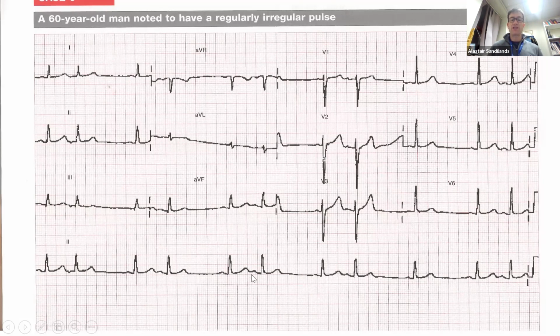So you can see, imagine that this is just one beat of an atrial ectopic, just one beat on this. Okay, it doesn't go any further. Any questions about that? Okay, so it's just trying to explain a concept to you. So this is one beat of an atrial ectopic.